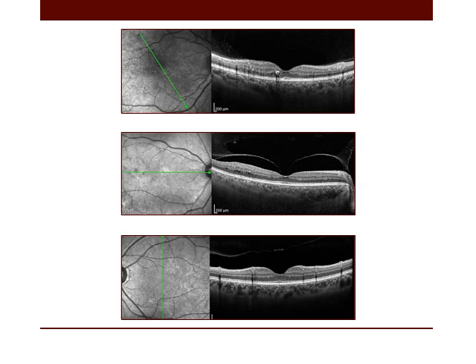In this patient, it is a very nice case with early diabetic retinopathy, and as we can see here, the posterior hyaloid is in place, not detached. A good news and a bad one. A good news because there is no vitreomacular interface abnormalities. However, the bad news, we don't know what the future carries.